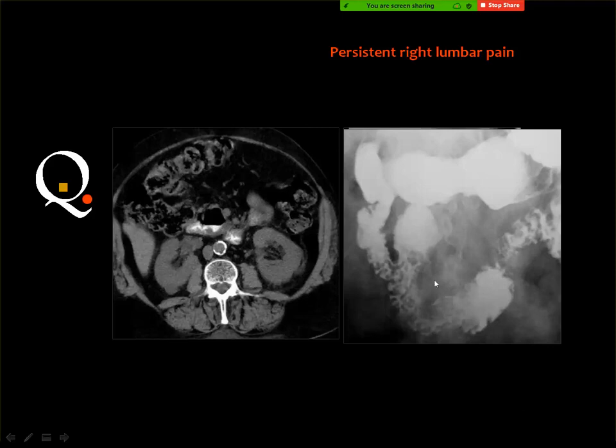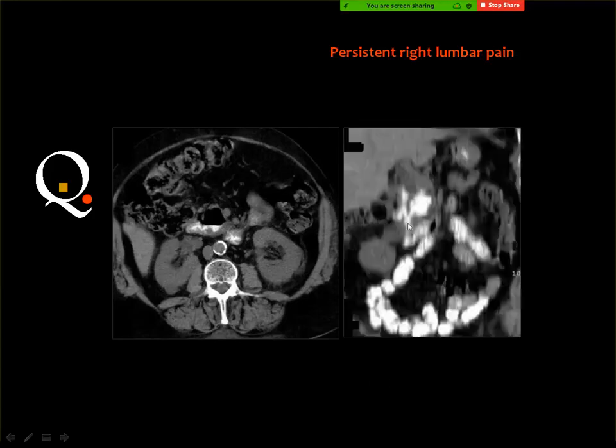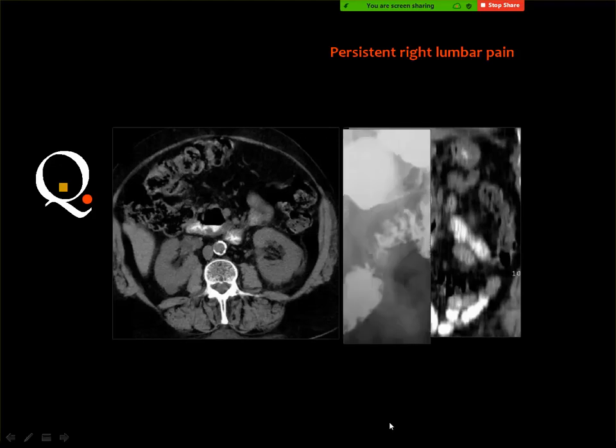Yes, duodenal diverticulum. And the duodenal diverticulum here in the reconstructed image, you see the connection to the second part of the duodenum. This is usually the image which is supposed to come in the exam, where you see an air bucket with air fluid level inside, which is intimately related to the head of the pancreas. Then you know that this is a duodenal diverticulum.